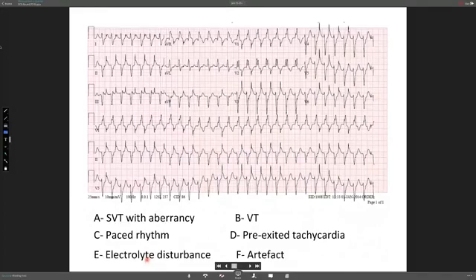So one question is whether a notch represents the P wave. This is what I learned from my mentors: we always have difficulty interpreting the ECG when we try to look for some P wave. One of the problems is over-interpretation of the P wave. I honestly will not say with confidence. I'm sure there is some, but can you say with confidence that this is, for example, a P wave here, or is this just interventricular delay? I honestly can't say with confidence that I could see any P waves.